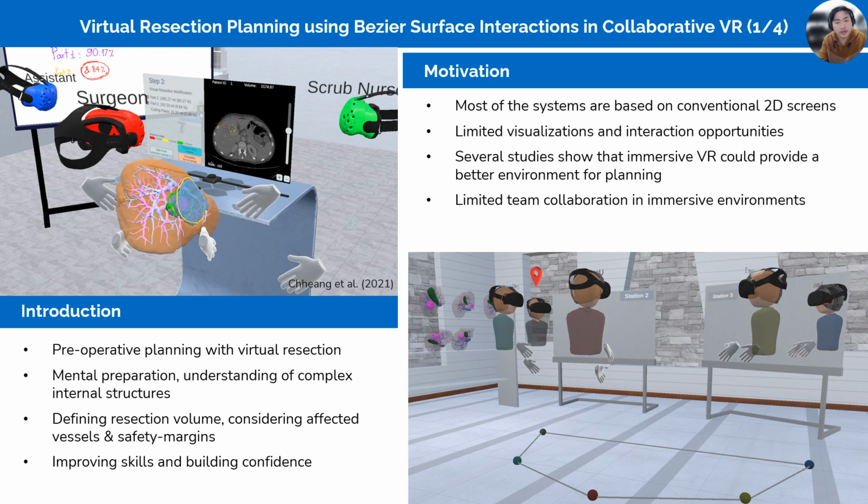The use of collaborative VR in the context of training medical students or planning together a surgical intervention could allow them to safely perform in the virtual environment, improve their skills respectively, and discuss the result with the supervisor directly in the virtual environment.